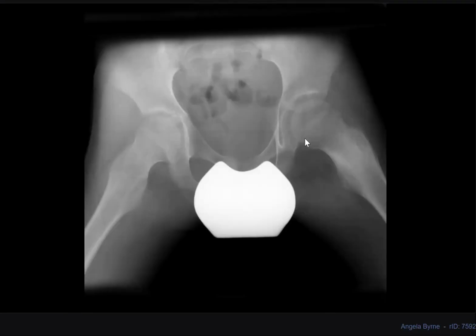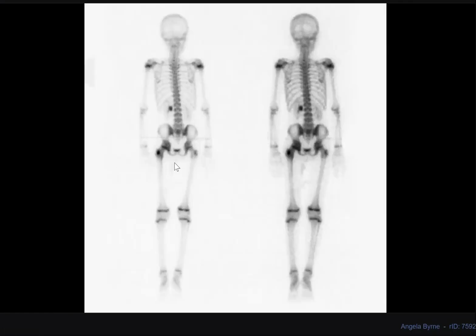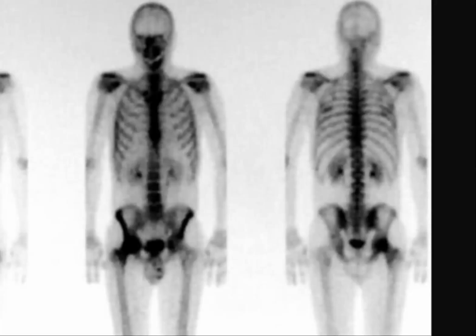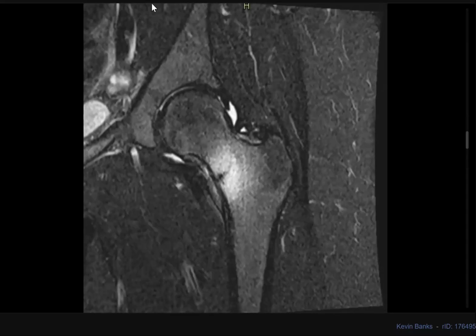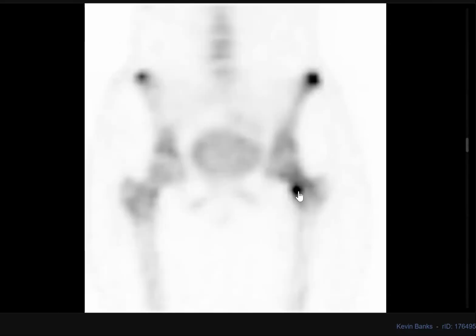Maybe this is another patient, maybe osteoid osteoma, but osteoid osteoma has a classic double density, with increased density in the inside more than the perimeter. And also maybe something like this: stress fracture. All these lesions cause an area of uptake at the medial aspect of the femur or the proximal or lesser trochanter. This was a stress fracture.